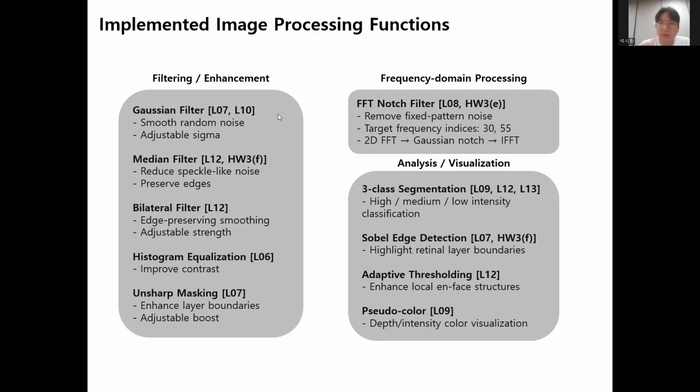For frequency domain processing, I implemented an FFT notch filter. It removes fixed pattern noise using 2D FFT, Gaussian notch filter, and inverse FFT. For analysis and visualization, the software includes segmentation, Sobel edge detection, adaptive thresholding, and pseudo-color visualization.